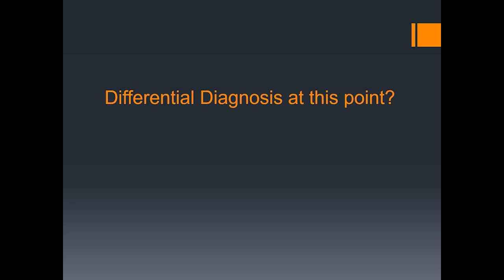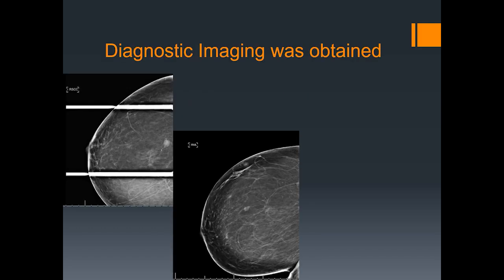We're thinking differential diagnosis. And the reason we're thinking about this is because we're following through on our RAD-Path correlation throughout. While we're limited in our BI-RADS codes from a screening mammography, we're certainly thinking about how we're going to do the diagnostic workup. Differential diagnosis: invasive carcinoma, skin finding, do we have 3D mammography or do we not? Lymph node, fat necrosis, and we're thinking about that as our patient returns for diagnostic imaging.